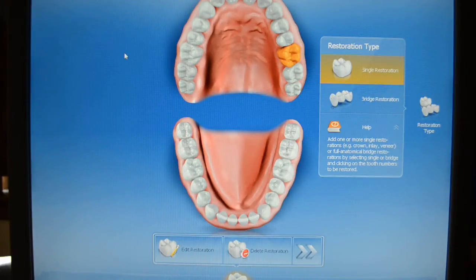So real quickly, if you remember, there are three ways to build teeth. Biogeneric individual, that means we're going to use other teeth in our patient's mouth, usually distal when it's a posterior tooth, or mesial to it if it's an anterior tooth, in order to recreate a tooth that we're working on that day. Biogeneric copy is when we are going to actually use the pre-treatment tooth, and we're going to literally copy, we're going to duplicate that tooth when we build our new tooth.